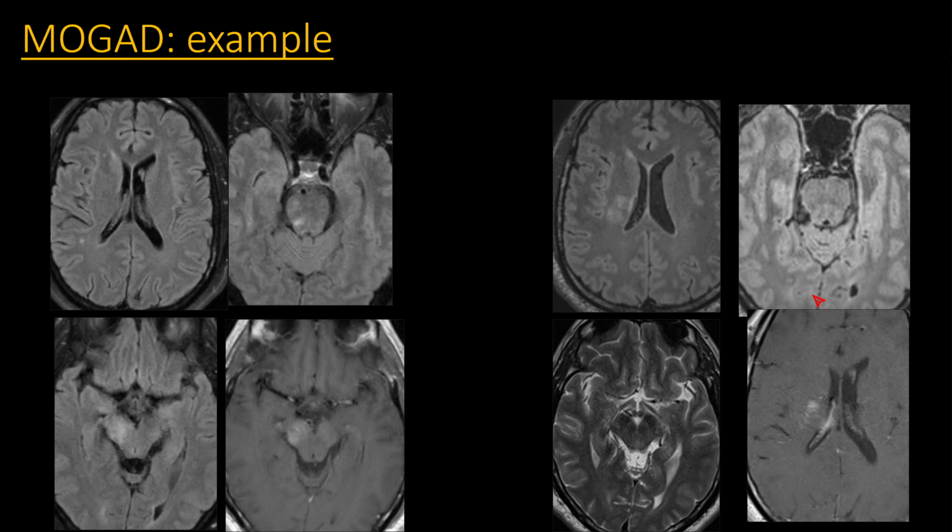On the follow-up image, you can see that particular lesion here involving the pons. It's pretty much gone. You don't even see any hint of it. Here's a T2 image, maybe just a tiny bit of a hint of it in the cerebral peduncle remaining.